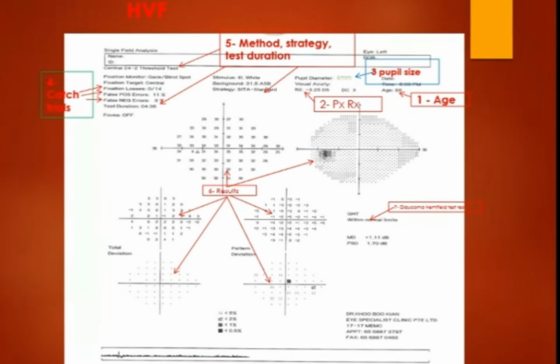If it's borderline, it means the patient is between not having glaucoma and having glaucoma. So these people whose glaucoma hemifield tests are borderline need to be monitored. You have to follow them up, always sending them for the CVF to check the progression of the condition and to check if the treatment regimen you're giving is actually effective or not.